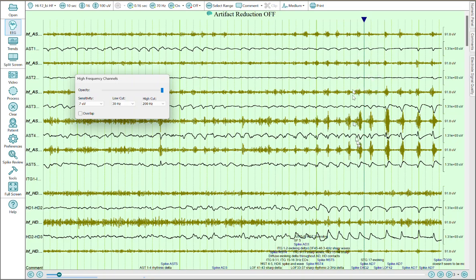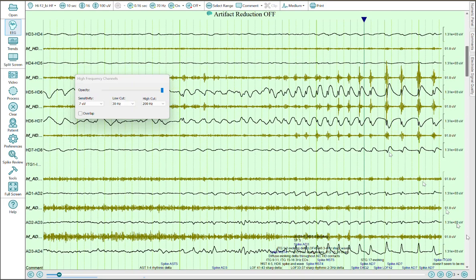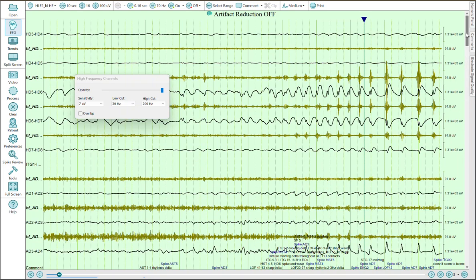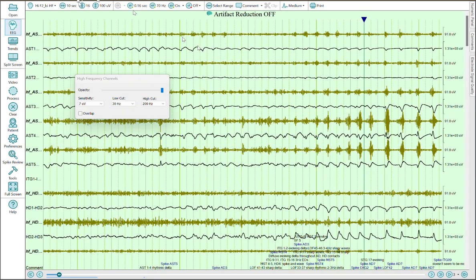And you can see that some of these channels have spikes, and some of those, which appear to have spikes, don't necessarily have the phase-locked high gamma here. So we're going to move past that without digging in too far. Well, actually, let's dig in a little further.